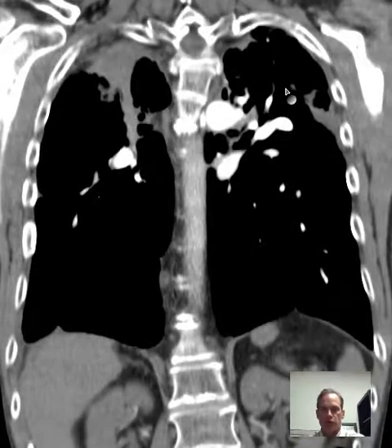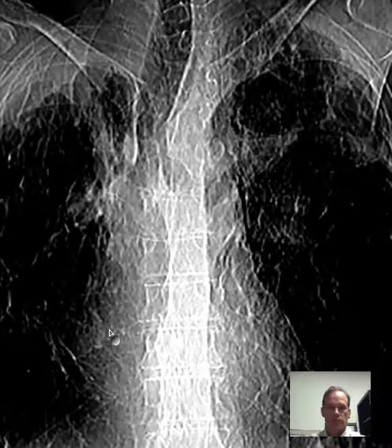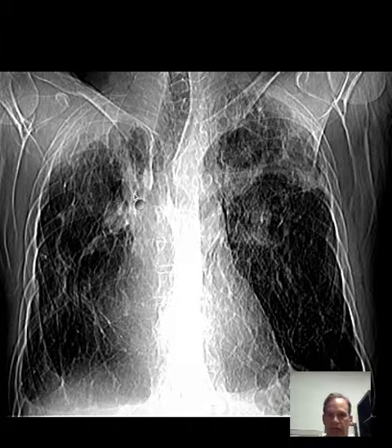Notice something else very interesting about this COPD patient. COPD being chronic obstructive pulmonary disease, and that encapsulates chronic bronchitis, asthma, and pulmonary emphysema. Look at the hilar. Now, if we were to look at the chest radiograph on this person, let me make it a little smaller there. You see the hilar? The hilar are too high.